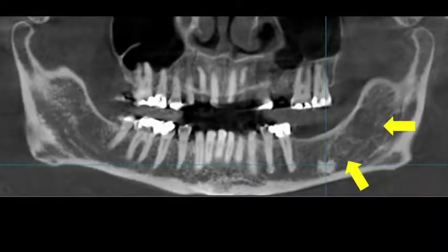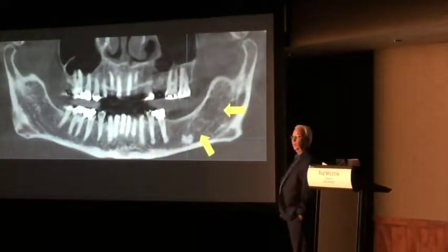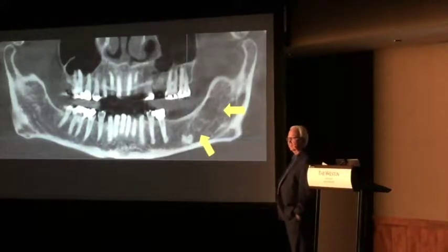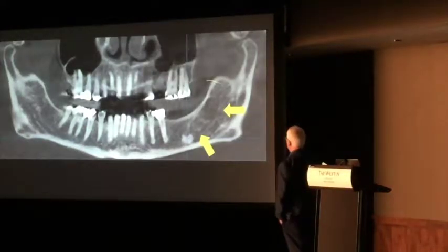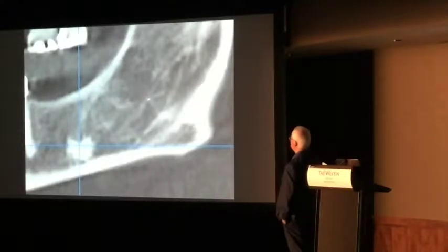Now, so I go in and I'm going, are they talking about this? Are they talking about this? Did they take the tooth out or do the root canal because some dentist in the past didn't know that was just a normal anomaly, you know? So I go in, I'm looking at that area, and I try and do sexy imaging. This isn't sexy. This is basically, I wasn't convinced there was something going on.